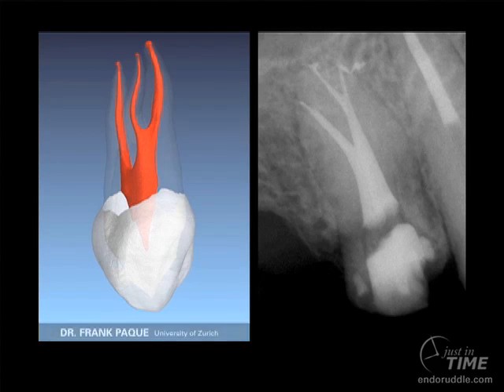So we'll always go back and look at Frank's work to show examples of a very unusual first bicuspid. This is a maxillary first bicuspid. It has a fused root, but notice that there is a middle 1/3 division, and then the more lingual branch divides again more deeply in the apical 1/3, and so we're setting this abutment up for a splint that will double abut on the first bicuspid and the canine. Wouldn't it be nice to have complete endodontics?